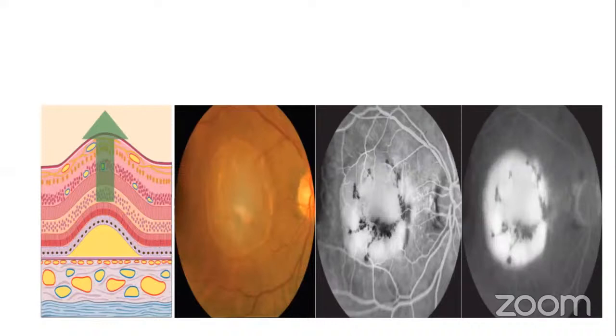So the vascular layers are spared. The hyperfluorescence you have is from beneath, it's from the choroid. This is sub-RPE fluid accumulation by exudation, pachychoroid complexes, where you have your thick choroid and leaky choroid as well, and a sub-RPE elevation.